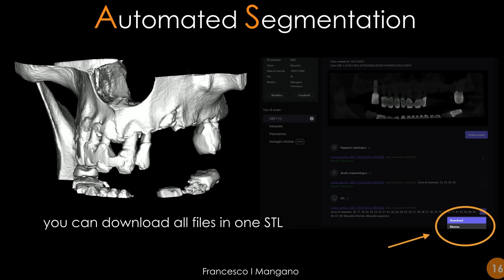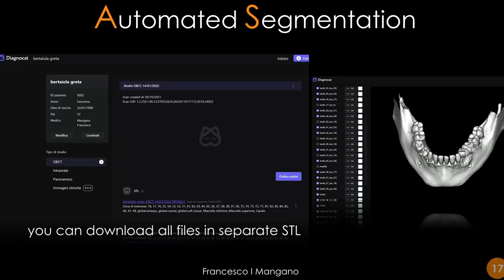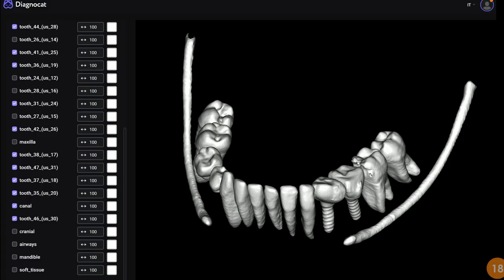But I just give you an idea of what you can do with a CBCT in which there is less metal. Basically, you can have a fast and affordable reconstruction of the bone volume and all the single teeth segmented separately and saved in STL. As you can see, this is how it looks like. It's perfect, and it is entirely radiological, and it's fantastic to have all this information from the CBCT. And each one of these files can be saved outside separately.